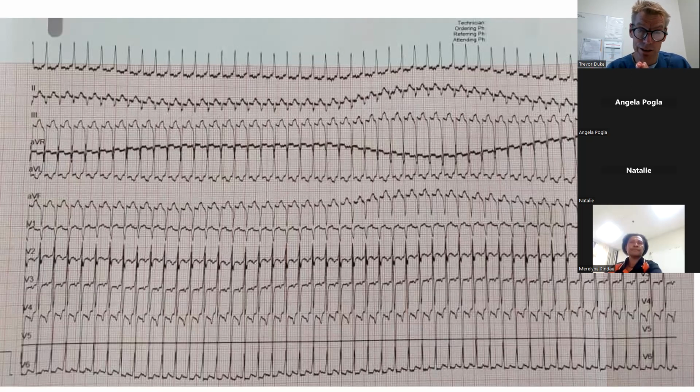If you see a tachyarrhythmia like this, are there P waves? If there are P waves, then you've got sinus tachycardia. If there aren't P waves, then you may have some other form of tachycardia. If the QRS duration is normal, if it's a narrow QRS, then it must be supraventricular. And if the QRS duration is prolonged, like wide, then there must be some block or some aberrant pathway in the ventricles.